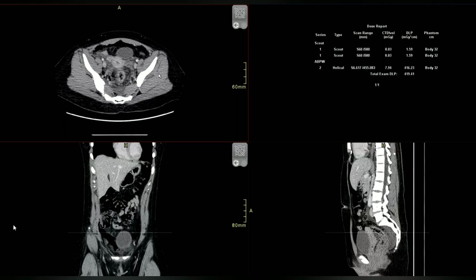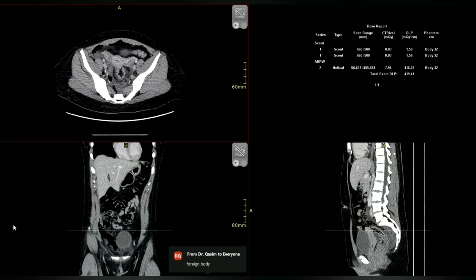Rectal perforation. Did you specify any history for me? No, I didn't give you any history. I withheld it. Okay. I'm just asking you what could be the causes. So the causes could be a foreign body that could have caused it. The causes could be trauma. Yes. Right? So this patient had a ski accident. Skiing, when they ski in the ice. So that's what. Yes.